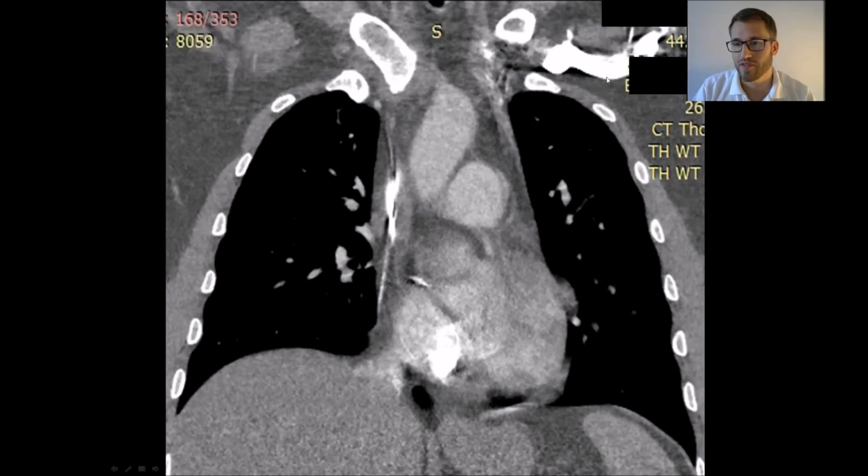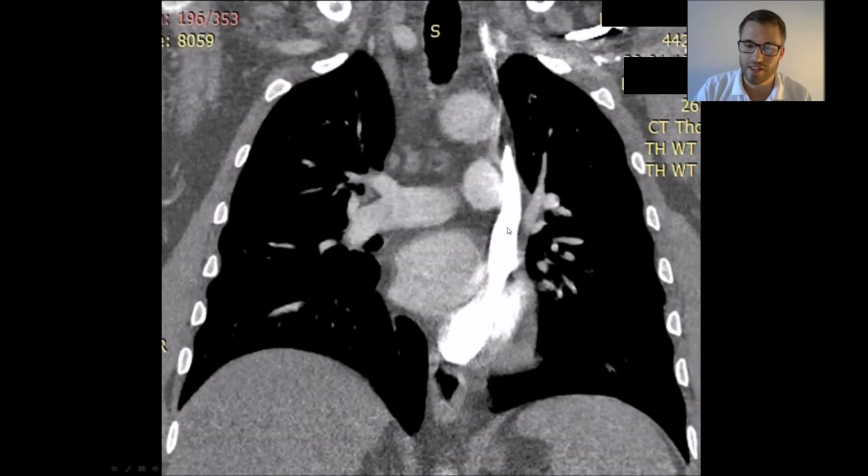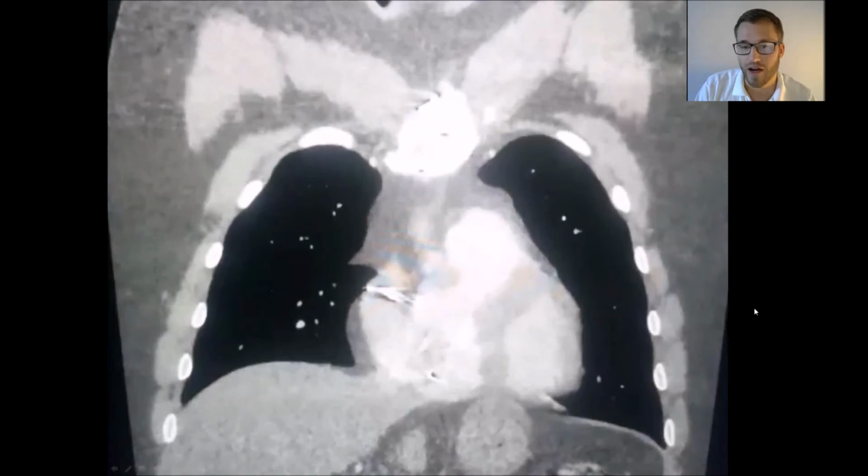I copied some pictures for you. So over the left arm and the venous line, the contrast comes here and fills the left vena subclavia, and then goes down into the persistent left vena cava superior, not crossing the thorax and connecting to the right vena cava superior, but going down here, connecting to the coronary sinus and into the right atrium, what confirms our hypothesis and our theory.